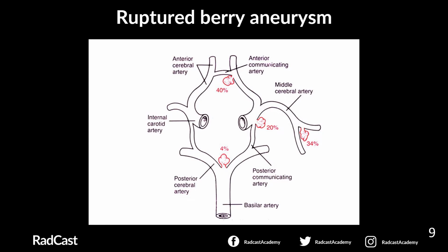As we discussed, ruptured aneurysm is the most common of the non-traumatic causes. It is due to deficiency in arterial wall strength, which makes the wall liable to formation of aneurysm, so easy to rupture and bleed. We see here the circle of Willis, which includes anterior circulation and posterior circulation.